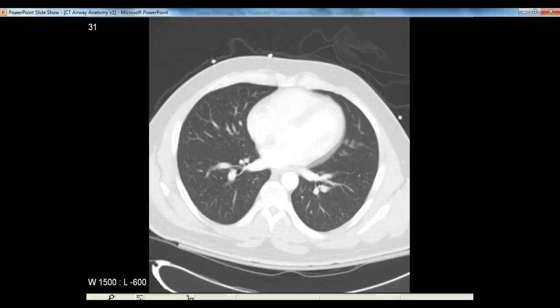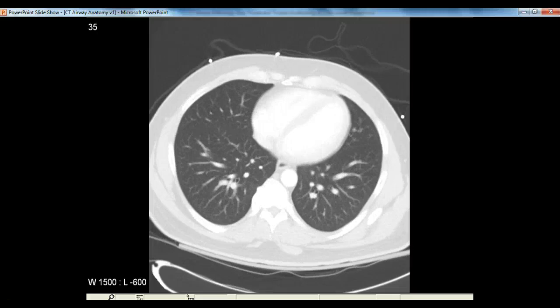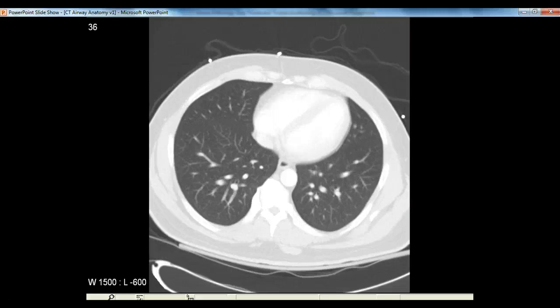It's right behind the sternum in the front, slightly to the left, squishing the left lung more than the right, and that's why most likely we've got 3 lobes on the right and only 2 plus the little tiny lingula, which is probably just a squished third lobe on the left. So we follow our way down. You can see now right behind the heart, you've got the aorta, and between the two you've got the esophagus. You can see it there.